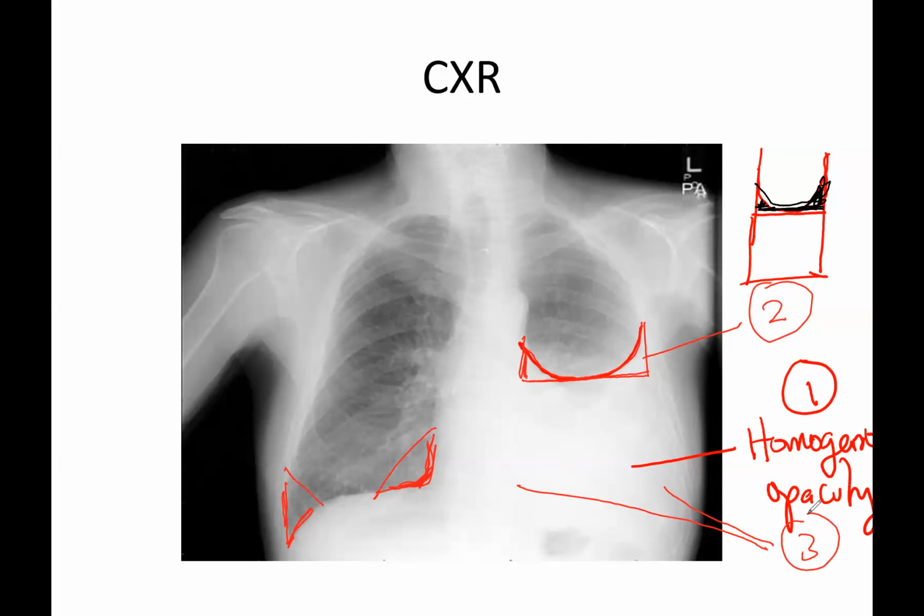So this is an image of a left-sided pleural effusion. For these three reasons, we demonstrate. So let's proceed to see the next image.